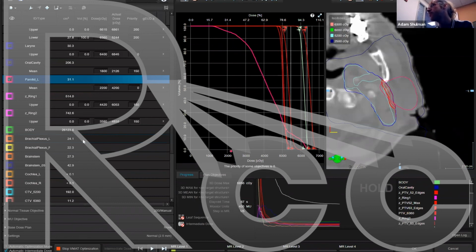I want a maximum dose of 50%, 3 millimeters away. When I look at an SRS plan of a single met lesion, I'll use my measuring tool and put in my 50% isodose line and measure. If the planner doesn't have about 3 millimeters from the PTV surface, 100% coverage to the 50% isodose line, then they can probably push it more. Of course, there are caveats to this in terms of the complexity, the size of the PTV, and its adjacency to organs at risk, but that's a pretty good rule of thumb, just to give you a sneak peek.